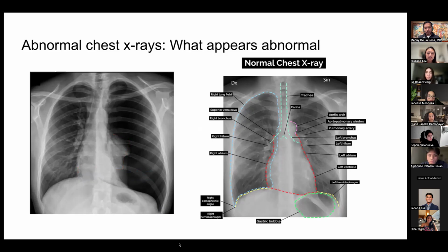This is... Do you want to have them try to guess it? Yeah, I just wanted to make sure I didn't reveal it first. Right, sure.